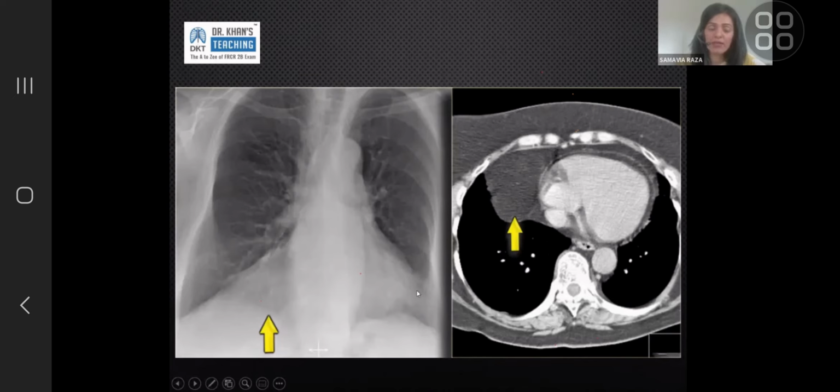It gets more confusing when it's an inpatient film, when it's underpenetrated, when the patient is too big and they're not really sitting up straight. This can look quite dense, or when the hemidiaphragm is a bit raised. So quite often people measure the heart from here to there and call it an enlarged cardiac silhouette. But that wouldn't be representative of cardiomegaly. On plain film, it can be more confusing.